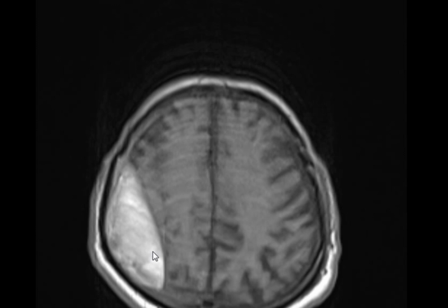Which one is more common in the elderly: extradural, subdural, or subarachnoid? Subdural is much more common, due to blood vessels and due to brain atrophy. Now, the question is, what is the age of this hematoma? That's the main teaching point of this case.